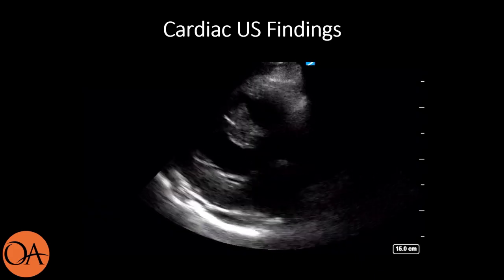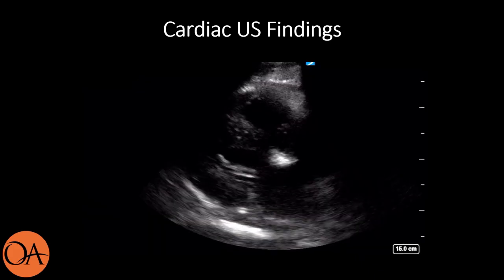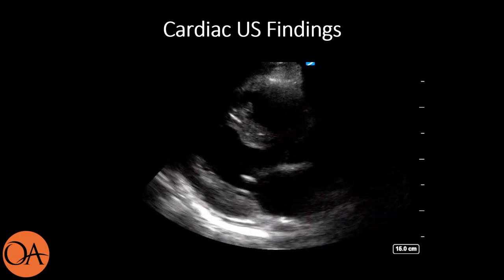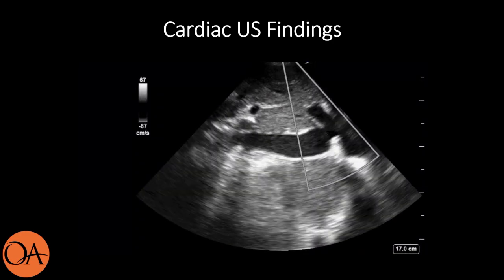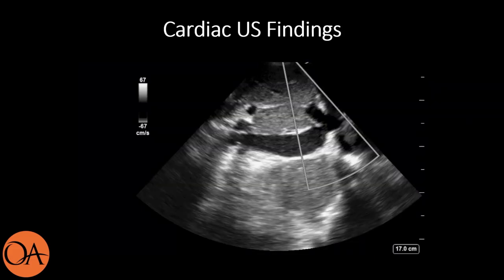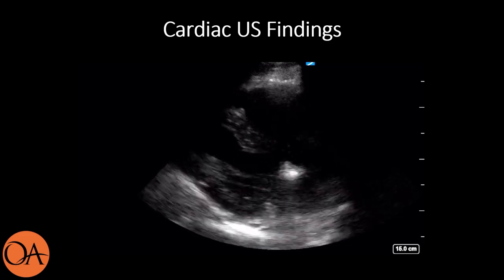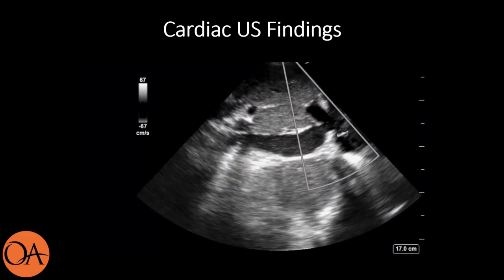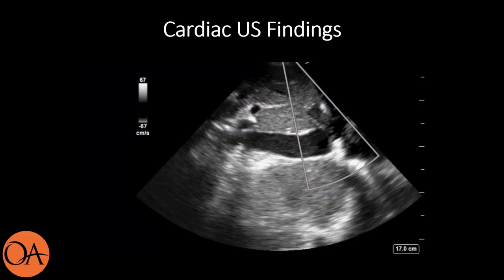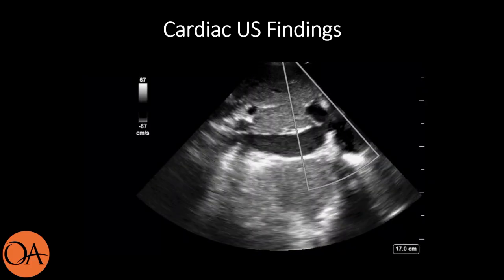In this patient, who presents with orthopnea, the interrogation of cardiac ultrasound findings demonstrating left ventricular hypertrophy and a dilated IVC further supports this etiology. Taken together with the patient's history of end-stage renal disease, the most likely diagnosis is volume overload due to diastolic dysfunction or an acute decompensation of heart failure.